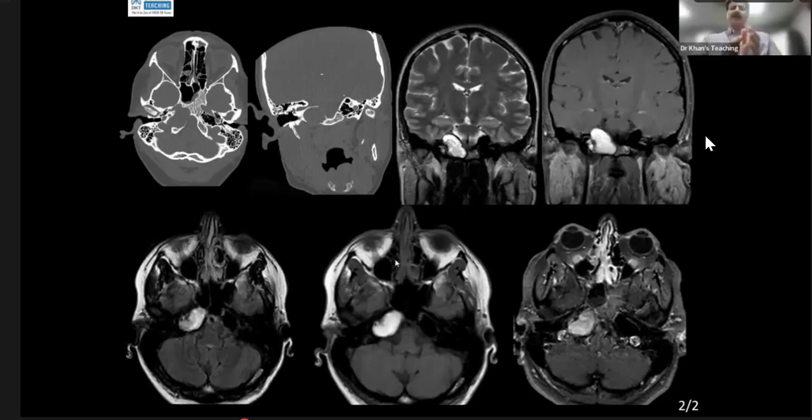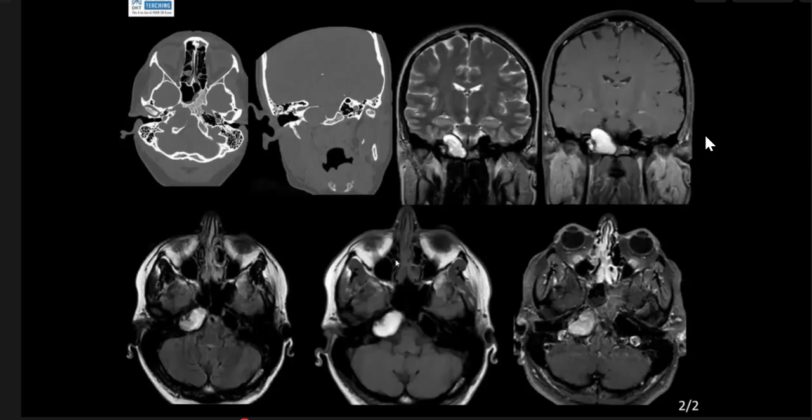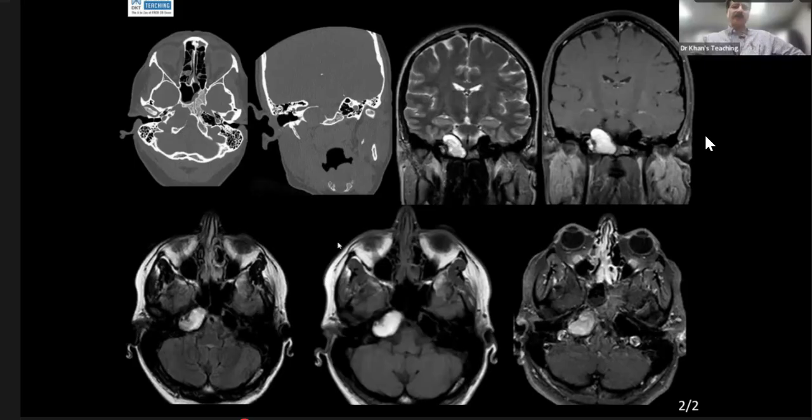Fat containing, you can take with a pinch of salt. There will be some fat, but in that location, or maybe it's just sort of blood. Blood, excellent. So an aneurysm. A thrombosed aneurysm. Okay, let me take over. It's an Aunt Minnie case.